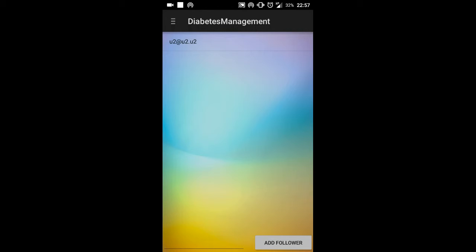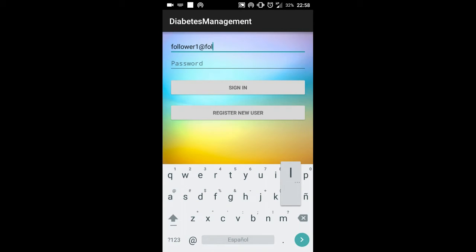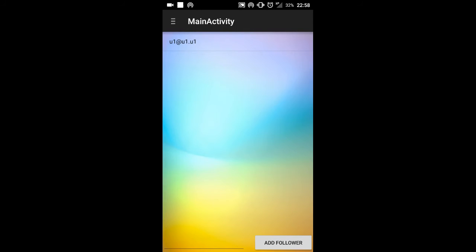I will log out again and log in as follower 1. Let's sign in, and here we have user 1 that accepted our request.